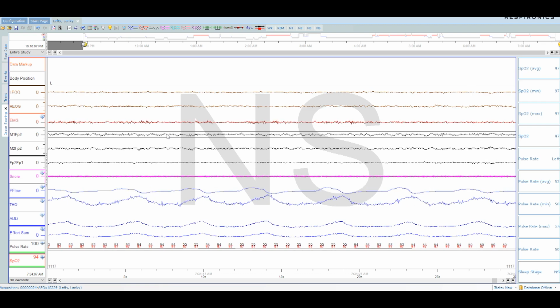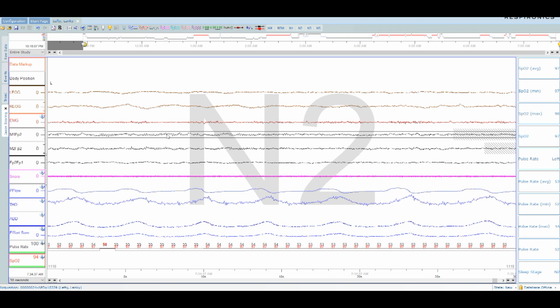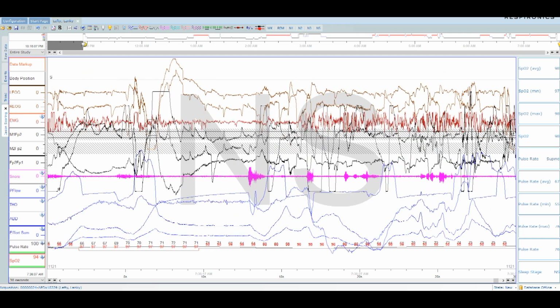So this is stage 2. I'm guessing junk sleep is about to start coming up. And by junk sleep, I mean people usually start having a bunch of centrals. Looks like I'm going to wake up. This was a fairly good night. I'm not sure, like I said, what night this was, but my God.